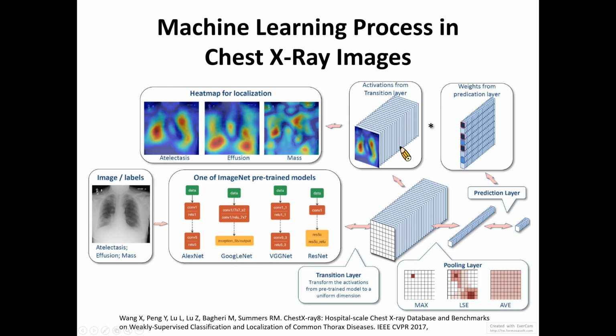the tutorial, and you can see that here you can analyze the network. Then you will see a window pop up. This is the full information about the deep learning neural network architecture. On the left, you can see the different layers. You can click on each one and see the specification of these layers.